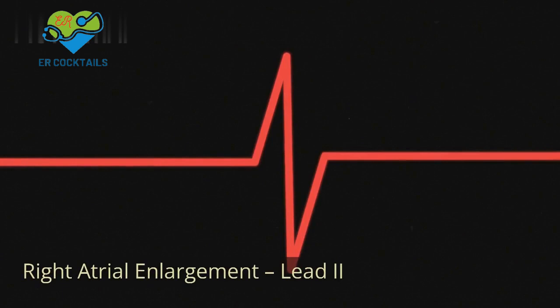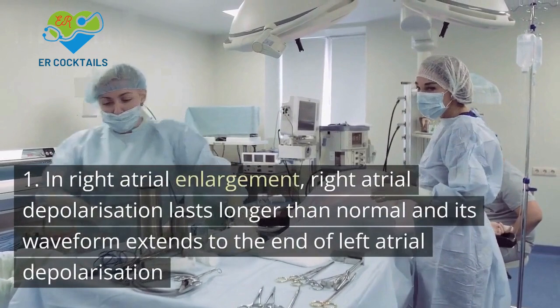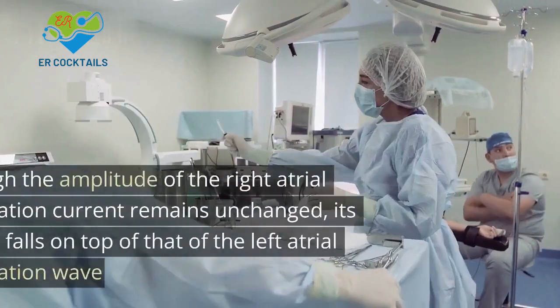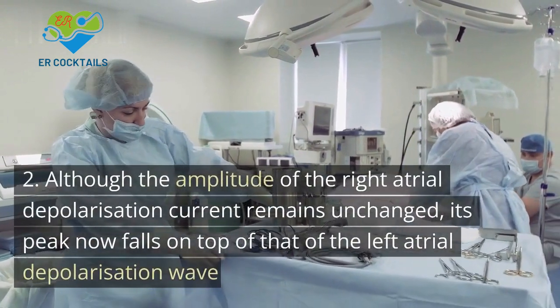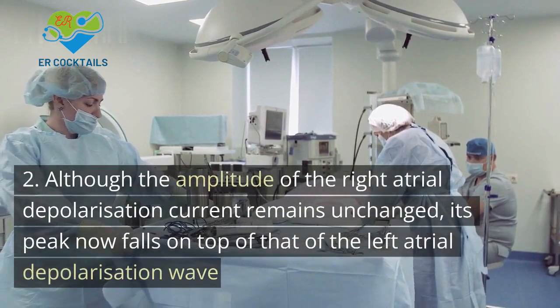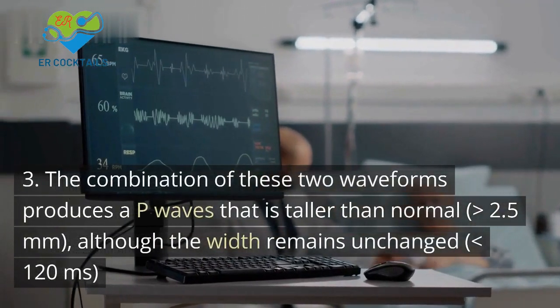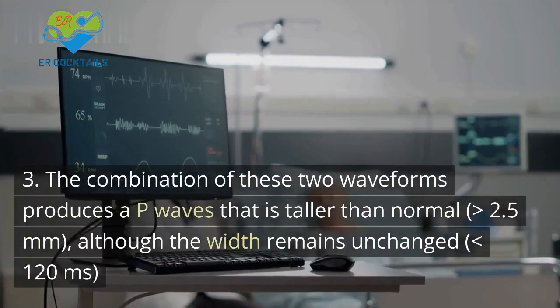Right atrial enlargement, lead 2. 1. In right atrial enlargement, right atrial depolarization lasts longer than normal and its waveform extends to the end of left atrial depolarization. 2. Although the amplitude of the right atrial depolarization current remains unchanged, its peak now falls on top of that of the left atrial depolarization wave. 3. The combination of these two waveforms produces a P wave that is taller than normal, greater than 2.5 millimeters, although the width remains unchanged, less than 120 milliseconds.